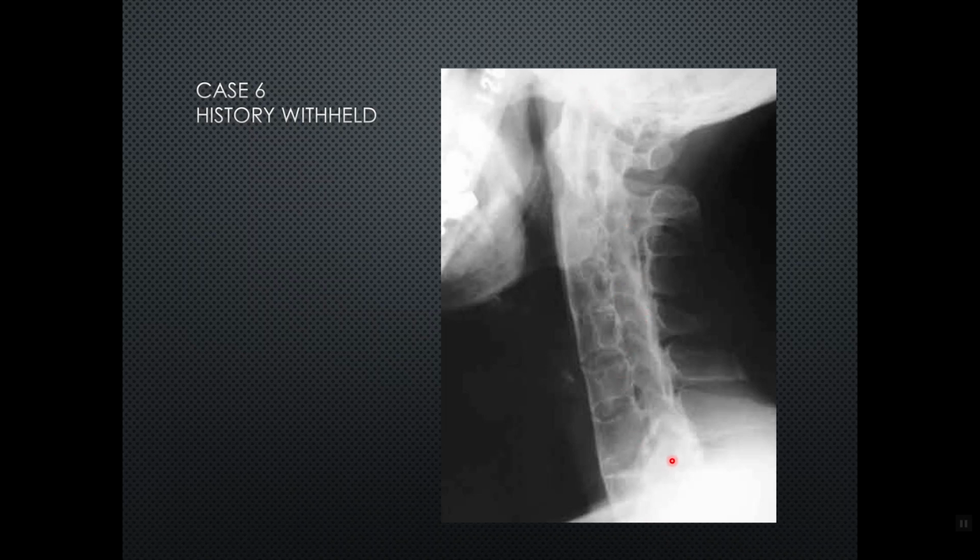In this case, we also have some complications potentially developing. This spine is very susceptible to fracture, and when a fracture occurs, we typically deal with a carrot stick or chalk stick fracture. It's the same thing, a very significantly unstable fracture. The other important feature: all this post-inflammatory fusion and remodeling of the bone can potentially lead to canal narrowing, canal stenosis, and some neurological complications. All patients with inflammatory arthritis, including AS and all the others, should be tested for instability and changes at the atlantoaxial joint at C1-C2 relatively early in the disease.